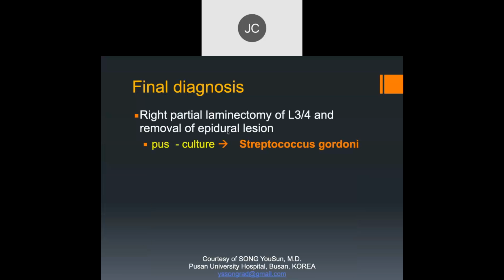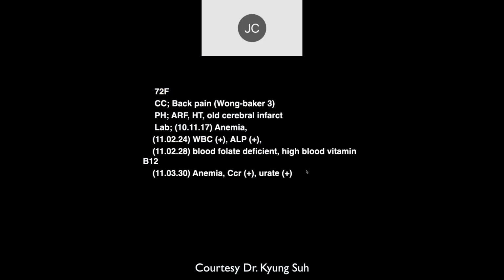The final diagnosis here turned out to be a streptococcus abscess in that area. But I think that almost always most people would call this a disc extrusion. So it's an interesting organism, and a bit of an unusual one. The tip off here is that this patient, if I remember right, was sick and actually had a fever. So it was more than just the typical back pain.